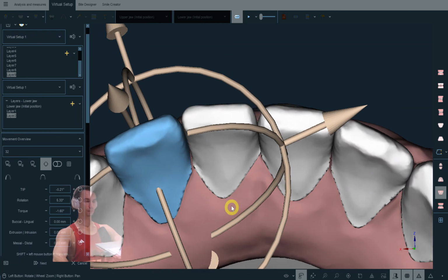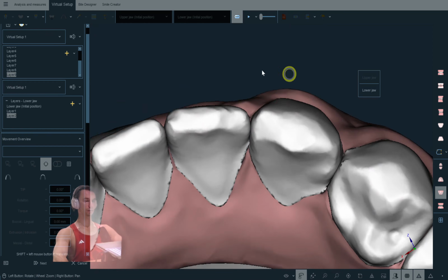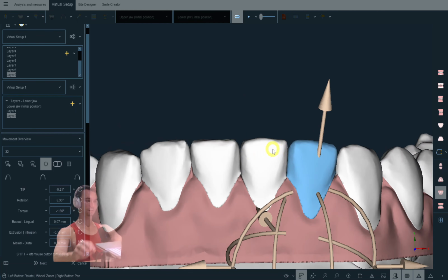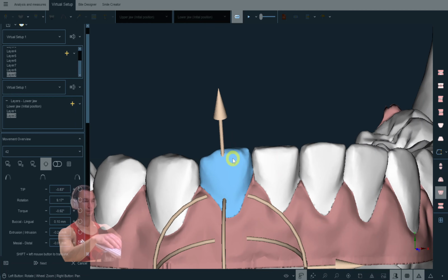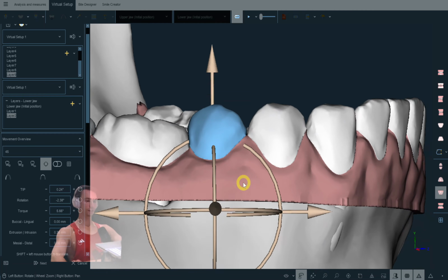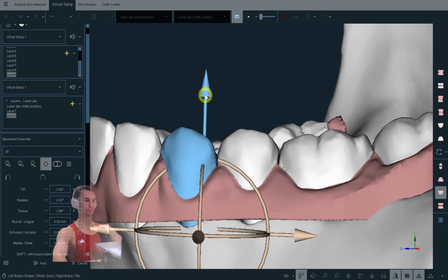I'm always checking, comparing the initial position of the teeth and the final layer. Check out where we need overcorrection. And yeah, let's make some intrusion for the lower incisors, and at the same time, through the premolars. This is also the reason why I set the axis this way. But I also use the keyboard, or we can use just the arrow.